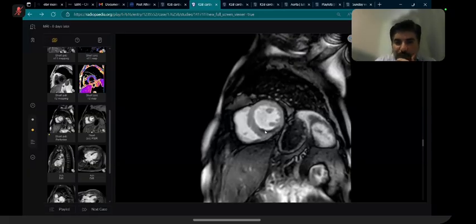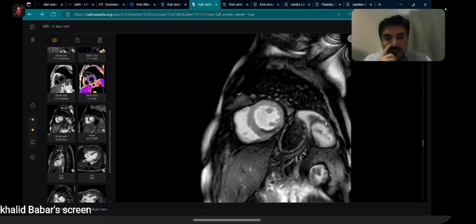Okay, and if you see a hypointense signal abnormality along the surface of the endocardium, it means there is microvascular obstruction. It means that there is acute myocardial infarction with a worse prognosis. If there is microvascular obstruction, it means the prognosis of the MI is worse. So this is something that you can see on the early sequence. So this is again an FRCR 2A exam MCQ.